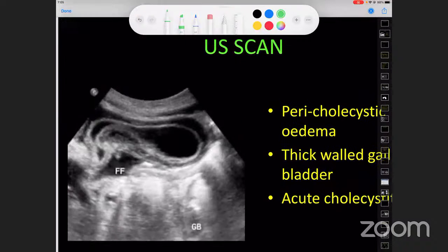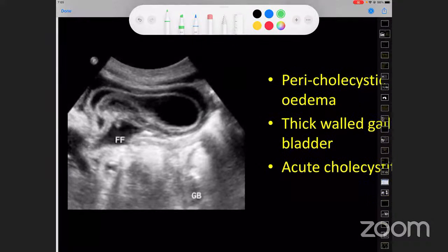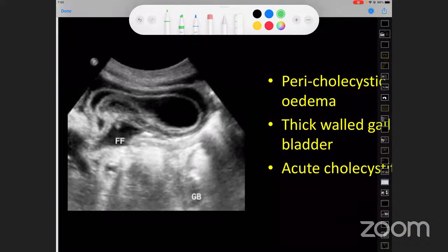Okay, now again coming back, because we are surgeons. The important thing is that this is one of the patients of an acute cholecystitis. Now we surgeons want you to read this one because we are really confused, because this strange thing doesn't look like a gallbladder. So we are both worried, Dr. Bakshi and I. So what is this? Okay, Avik, so please read this for us.